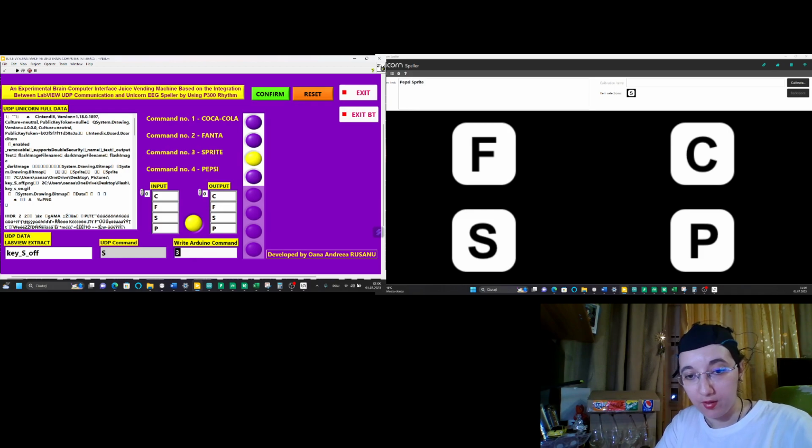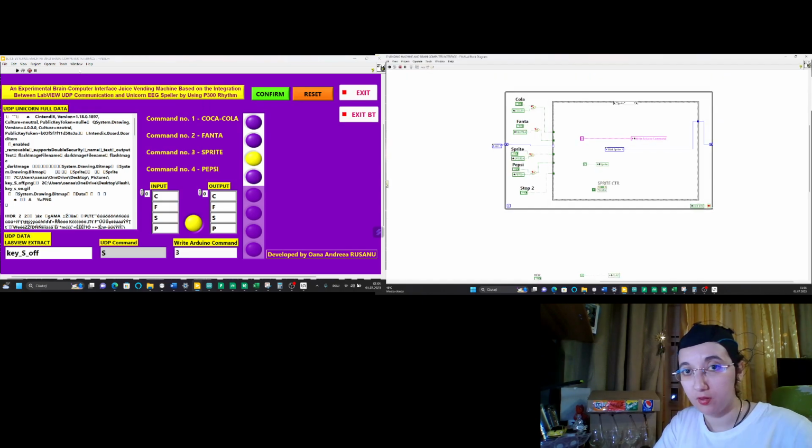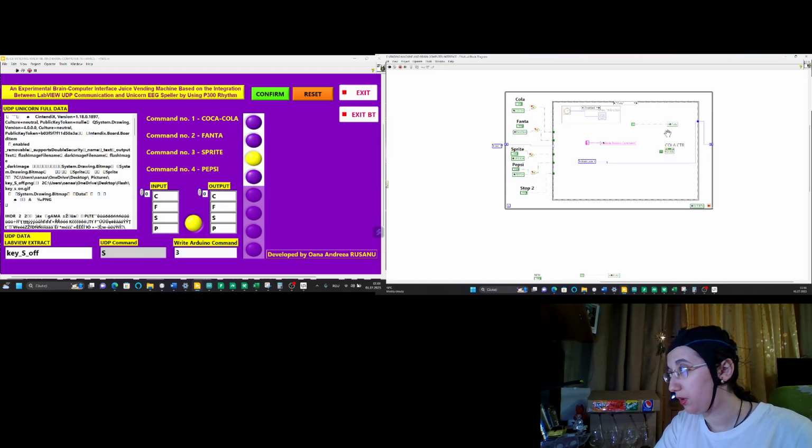Okay, so the three character corresponds to the stop command. So please monitor when I select F here in the Arduino text box, there will be another character. And after 4 seconds, again 3 is displayed. So every time I select a letter from here, such a sequence is executed. So we have a state machine. The cola sequence is executed.